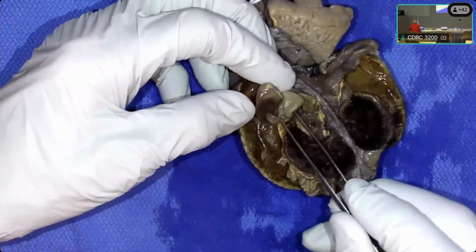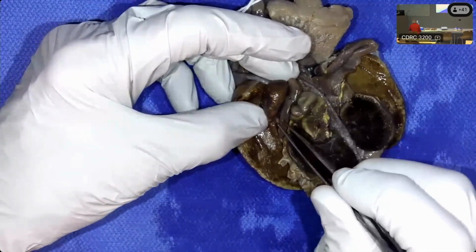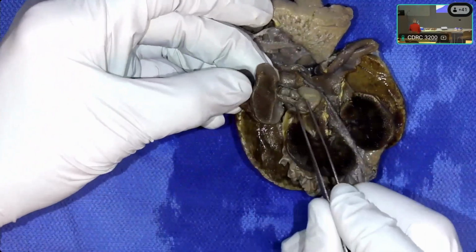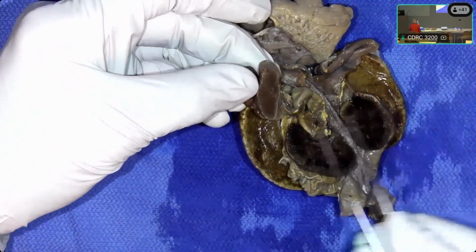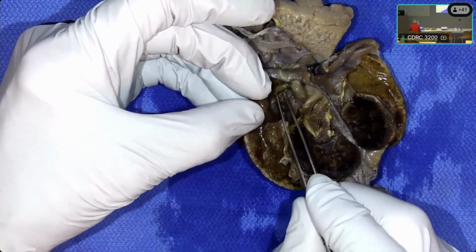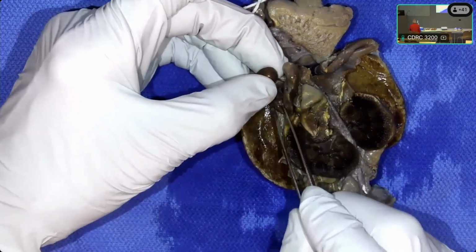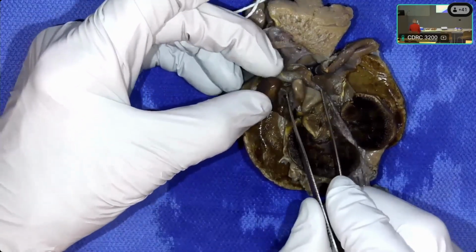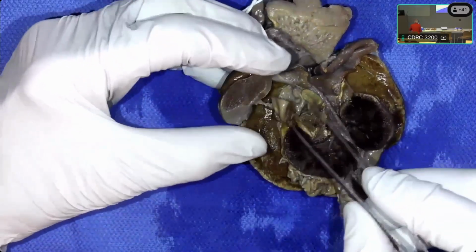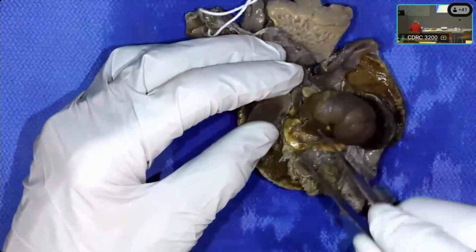As are the spleens. So here there are 1, 2, 3, 4 spleens. And the hallmark of multiple spleens, rather than just a plain old accessory spleen, is that they occur on both sides of the dorsal mesogastrium. So you can have 2 big splenules and multiple small ones, but if they're on both sides of the dorsal mesogastrium, that will for sure diagnose multiple spleens. So the spleens were on the left.